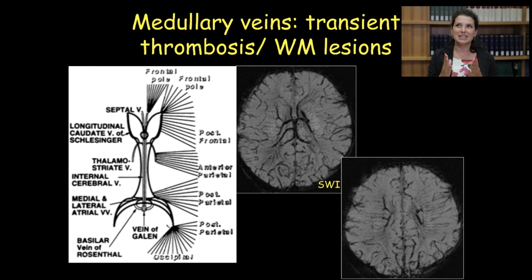And in reality, the relation between the two events is clear, because a transient thrombosis, a transient engorgement, caused the suffering of the white matter tissue, but is not evident anymore, neither in these susceptibility weighted images. Therefore, there's the reality of a transient thrombus that sometimes dissolves, but leaves the brain suffering.